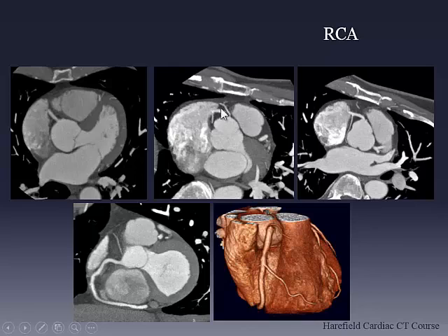Where it can be helpful to say that the conus has got a separate origin is if, for example, you're dealing with a stenosis in the right coronary artery, and your colleague at cath thinks that must be the right coronary that's occluded, and they're shooting into the conus. For those of you who do angiography, you know injecting into the conus is not a great thing to do because it can precipitate VT.